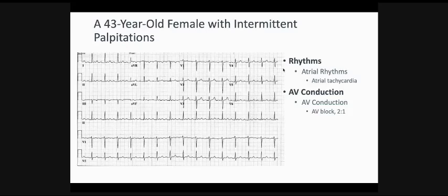And the reason why we choose an atrial tachycardia is because if you concentrate on the P waves in lead V1 and the P waves in lead 3, you cannot really tell where the P wave is and whether they're upright or inverted. The P waves in lead 1 and lead 2 are upright, but in lead 3 you find it isoelectric, and in lead V1 you find it negative. And that tells you that the firing is not from the sinus node or the AV node. There is an ectopic beat that causes an atrial tachycardia.